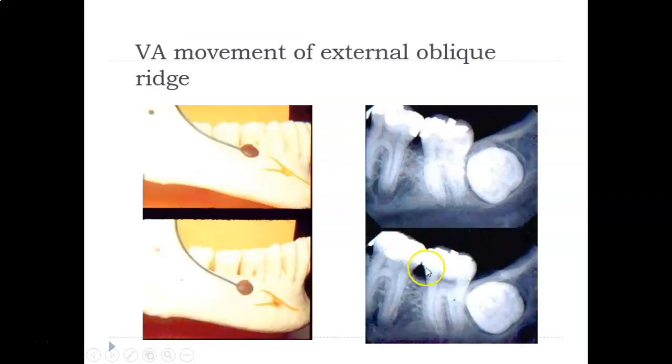There's another practice. And let's see, what is this doing here? So this is just, again, demonstrating, I think, the vertical angulation if you're moving your beam up or down in a vertical motion. So which one should we use as the baseline?